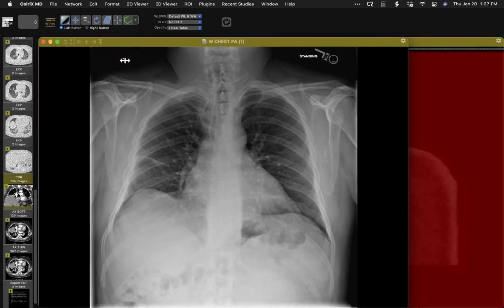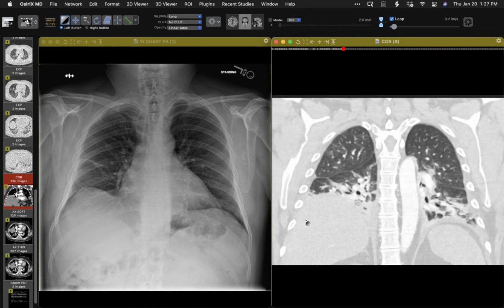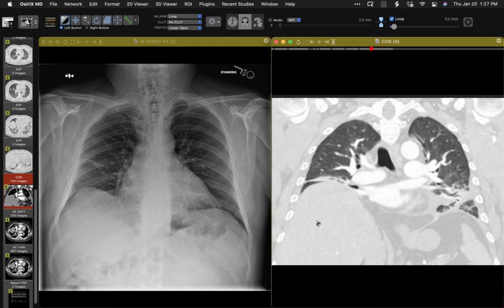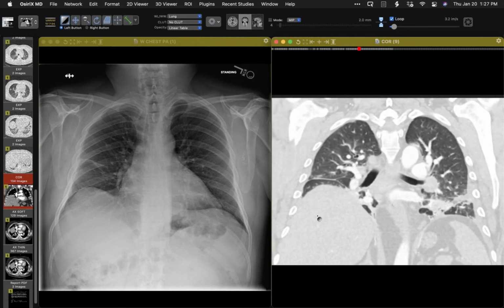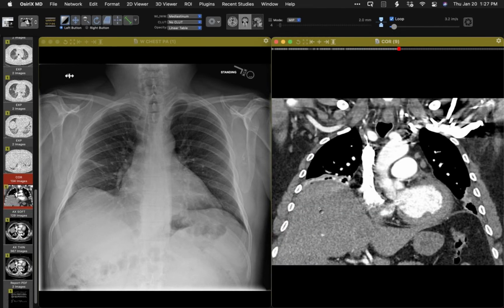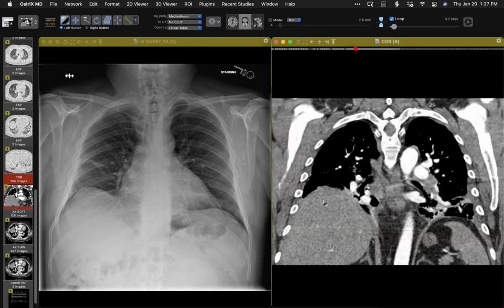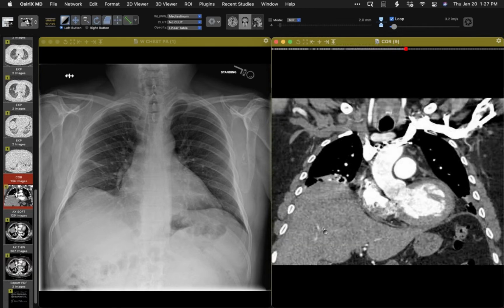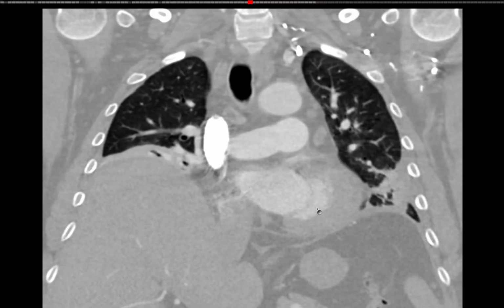this one. So you'll have to imagine what a chest radiograph is going to look like. And the striking finding is the underinflated lower lungs. And within those areas are opacities consistent with enhancing atelectatic lung. So multiple foci of basilar atelectasis, both sides. And he has restriction on pulmonary function testing, and the rest of the lungs otherwise look okay.